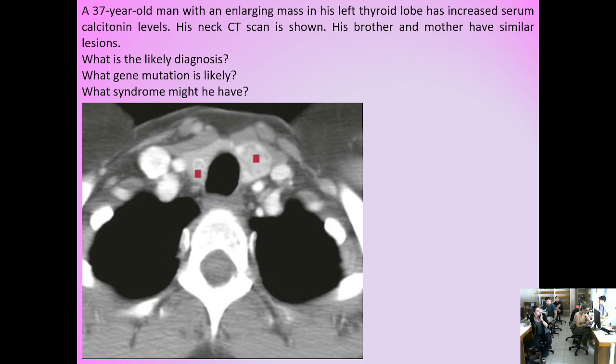Remember, when we have tumors with neuroendocrine differentiation, that means tumors being composed of neuroendocrine cells. These cells are detected immunohistochemically by synaptophysin, chromogranin, CD56, INSM1. These are immunomarkers of neuroendocrine differentiation.